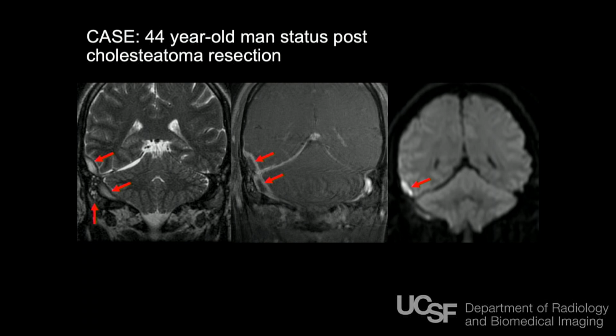Do you think that there's actually an abnormal extraaxial or intraparenchymal collection? And you're faced with these areas that are bright on diffusion-weighted imaging. And the question is, does that represent subacute hemorrhage, or does that actually represent pyogenic infection? It's a really common postoperative finding. My approach to this, by the way, is looking very carefully on the T1 weighted image for evidence that it's hemorrhage that you're looking at.